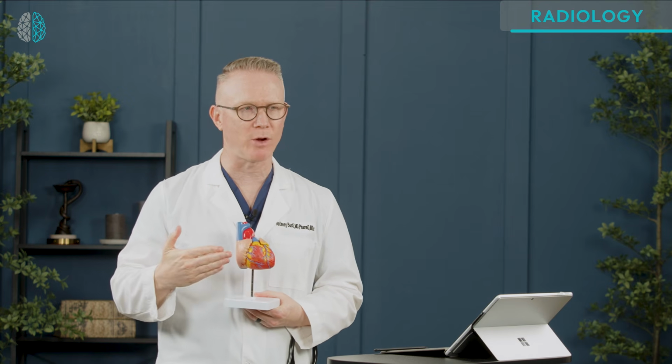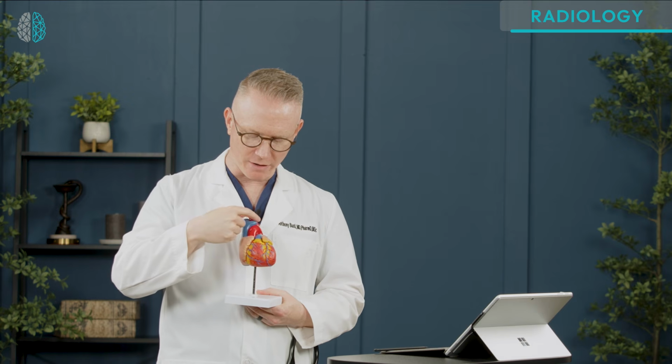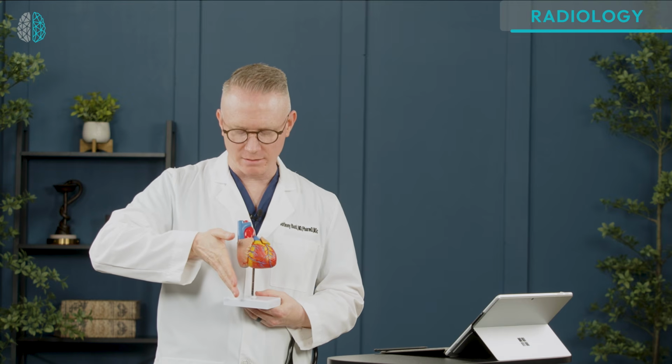But also the parts that are exposed in the front part of the chest, which is why I'm holding it this way, you can see the aortic arch coming out and around, and going behind the heart and down, right? The pulmonary artery. But the most anterior portion of the heart is actually the right ventricle. Over here on the right side of my body is the right atrium.